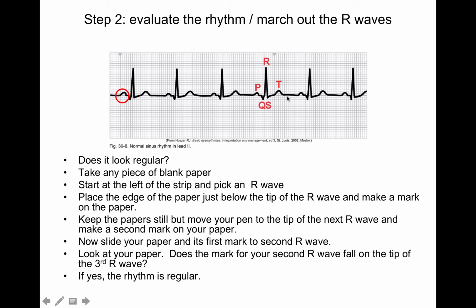So we're looking at the PR interval. I'm going to start here and end here, because my Q wave is here, my R wave is here, my S wave is here, and T wave is here. We're going to start at the beginning of the upslope and stop right where it starts to go down. That is our PR interval. On this person, I'm going to count 1, 2, 3, 4. It's right about 0.16 or 0.12. It's really hard since these are not matching up the way I want, but this is going to be a normal PR interval. So you can see that there.